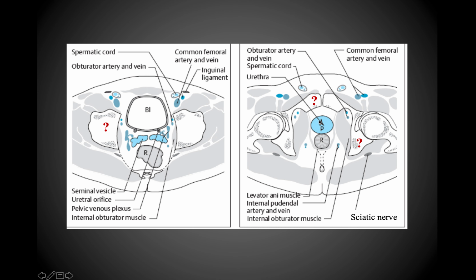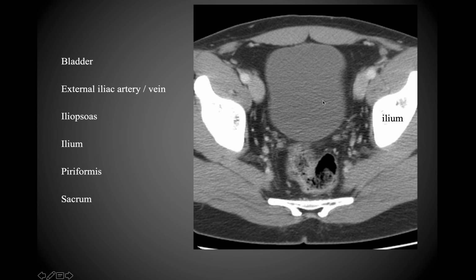And then the urethra, usually you can make out just a very small opening in the midpoint of the prostate, which represents the urethra, of course. And then anteriorly here, you can appreciate the pubis and then the pubic symphysis. So let's go through those now on a cross-sectional or axial CT view.